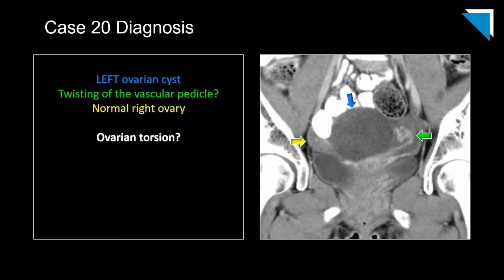I wanted to show this case to demonstrate some of the pitfalls of ultrasound interpretation. The performing sonographer's impressions are essential, and I frankly won't dictate an ultrasound case without a worksheet from the technologist. But it's also vital that each radiologist approach the images with a fresh perspective and formulate one's own opinion.